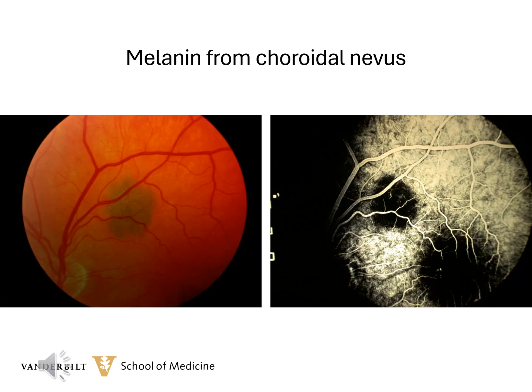Choroidal nevi will block the normal fluorescence from the deeper layers of the choroid, but in later phases may show a normal pattern of fluorescence on its surface. In this example, it's a fairly early phase of the angiogram, and you can see blockage of the normal choroidal fluorescence secondary to the choroidal nevus. There's also a very prominent area in the central macula that shows the normal hypofluorescence, but it's a little bit more exaggerated in this particular case.